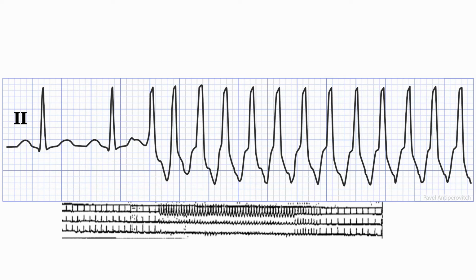So looking for P waves within the wide complex tachycardia, I see some high frequency deflections within the ST segment of the T wave. I see it less well after certain QRS complexes. This is a very fast wide complex tachycardia, and when it's so fast, the QRS is often quite distorted. And it's often very hard to see little P waves within it. But it's fairly reasonably convincing. We often call it candidate P waves. And I see this little bump after each QRS.